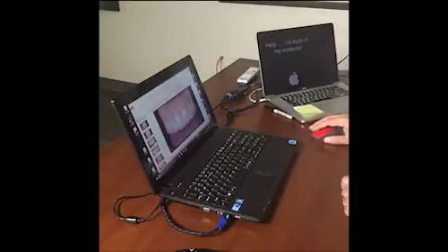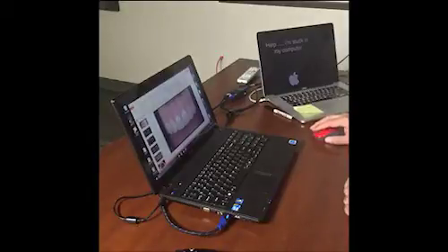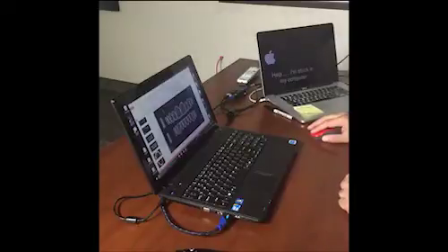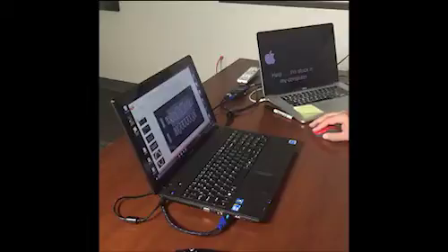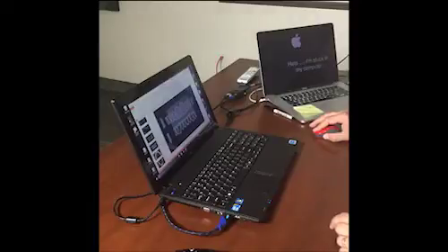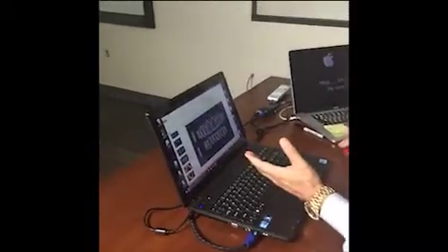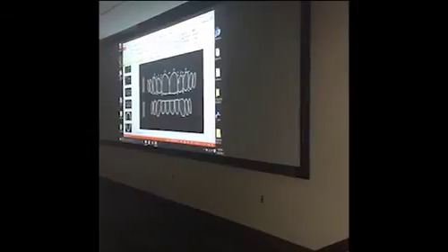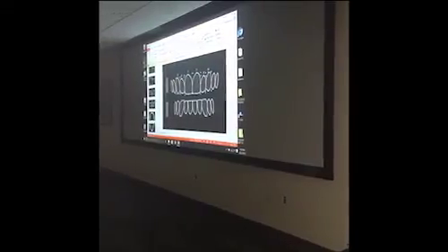We'll use this picture. If I want to put some drawings, some teeth drawings in there, let's go do the same thing. There is one little difference. It is a left click, and you must totally surround whatever you want to select. If you don't, I want you to notice that I'm touching lots of teeth here, but the only ones I'm surrounding are the 6 anteriors. They are the only ones that will select. Okay? When they select, I can then copy them, Control-C, because there is no Command key on a PC.